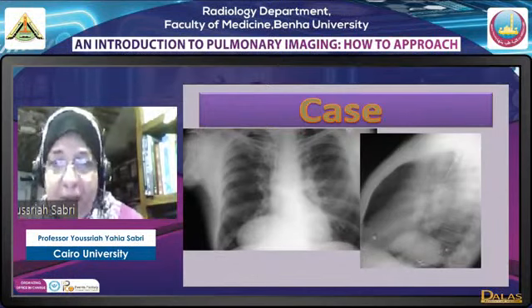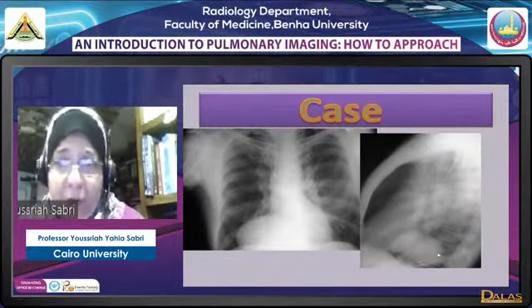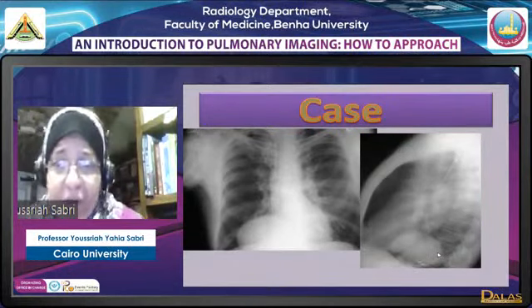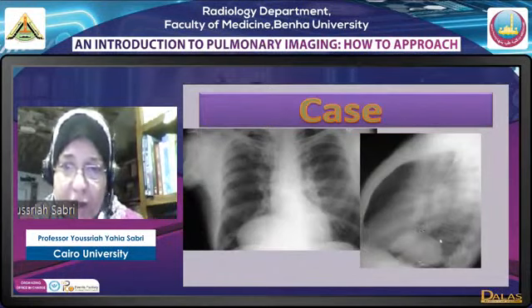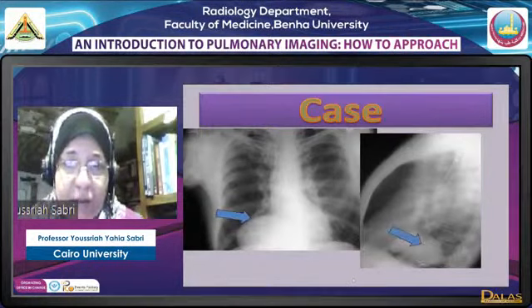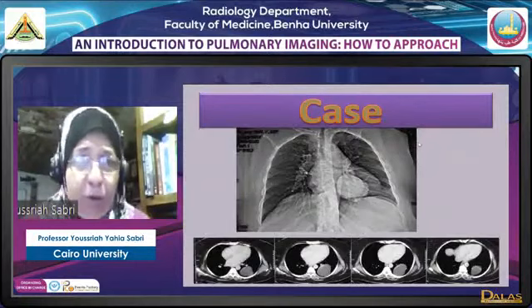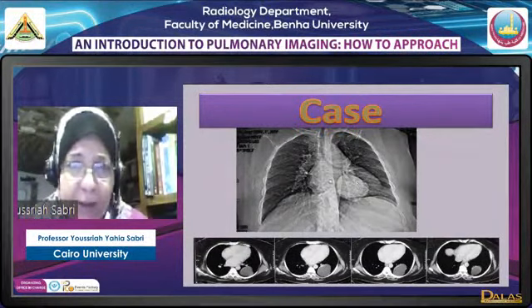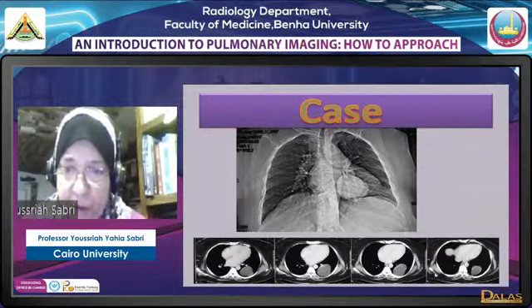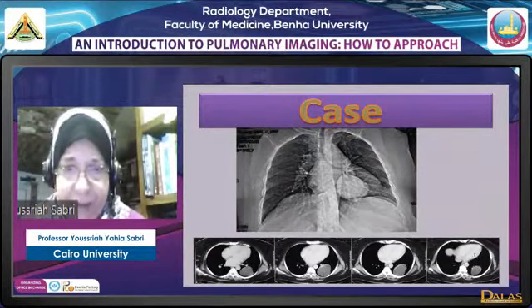As soon as we see a lesion of this size, this is benign looking, and not only benign looking, it raises the possibility that I'm dealing with a cyst, a fluid containing cyst. A smooth large lesion with outlining like this. This was actually a case of solitary hydatid cyst. Another case confirms this: a female patient in her 7th decade. Here, look, a very well defined smooth large mass lesion. When we look at tissue characterization, it's totally fluid content, again a case of hydatid.